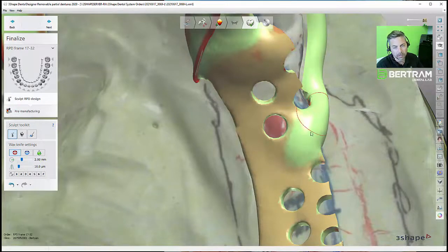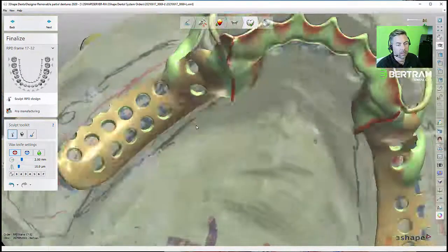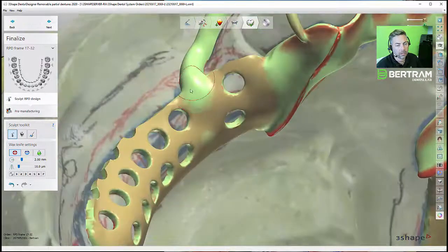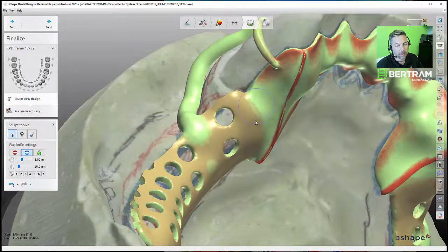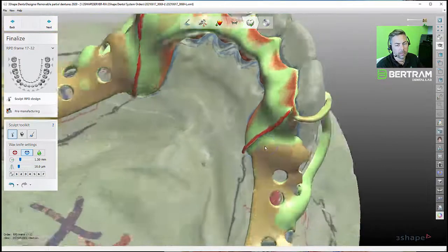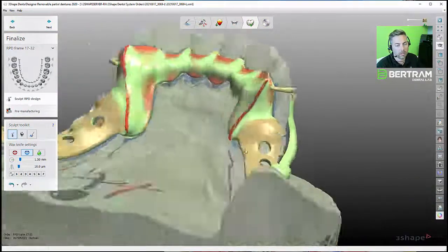Bring it up a little more here. I want this definitely solid where this arm is coming in. Bring this up a little, just get that actually flush. I'm going to define this distal guide a little bit better, trying to get more of that 90-degree angle where it meets the mesh and the bottom of the plate. All right, arms look good.